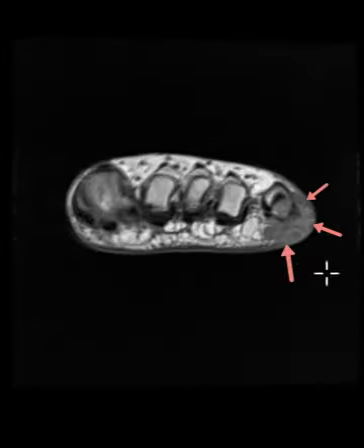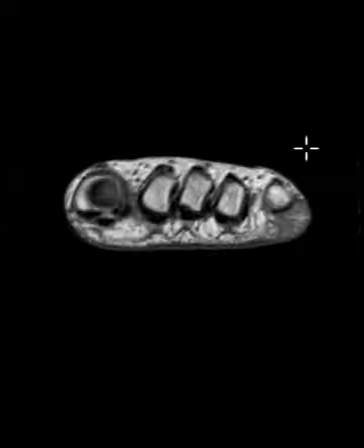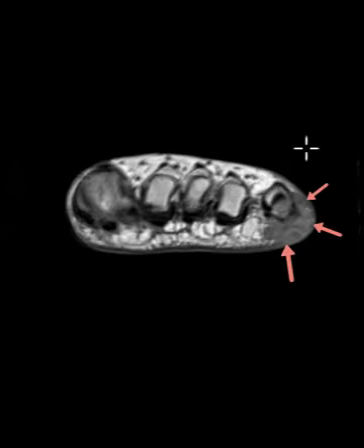And on this view right here, you see this gray tissue. So this is edema, inflammation, maybe some fibrosis and scarring as well, kind of a mixed inflammation and scarring, but it looks sort of tumefactive on this short axis T1 image right there, really classic. So a really prominent pressure lesion beneath the fifth metatarsophalangeal joint from chronic pressure, and this will cause pain and swelling there. In this case, it was mistaken for a stress fracture, and that's it.